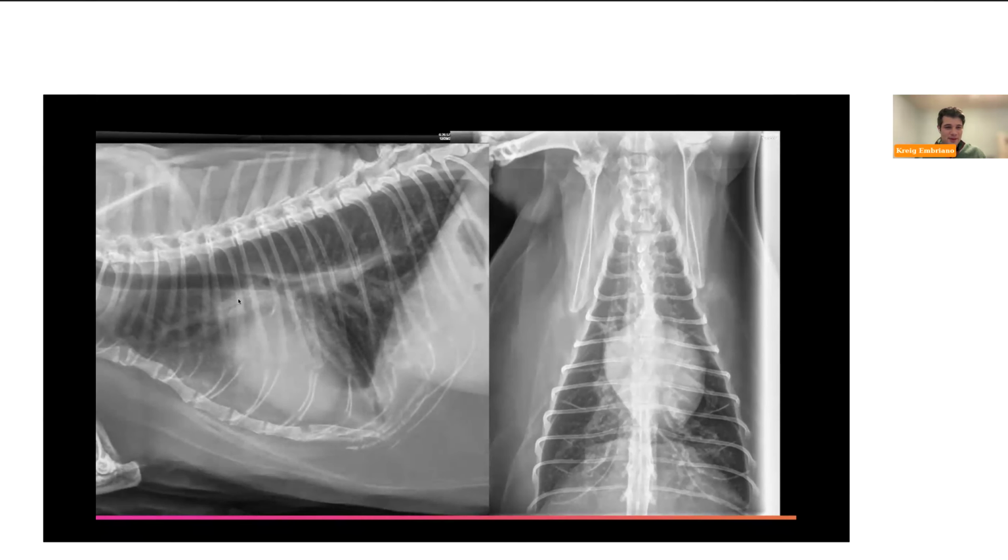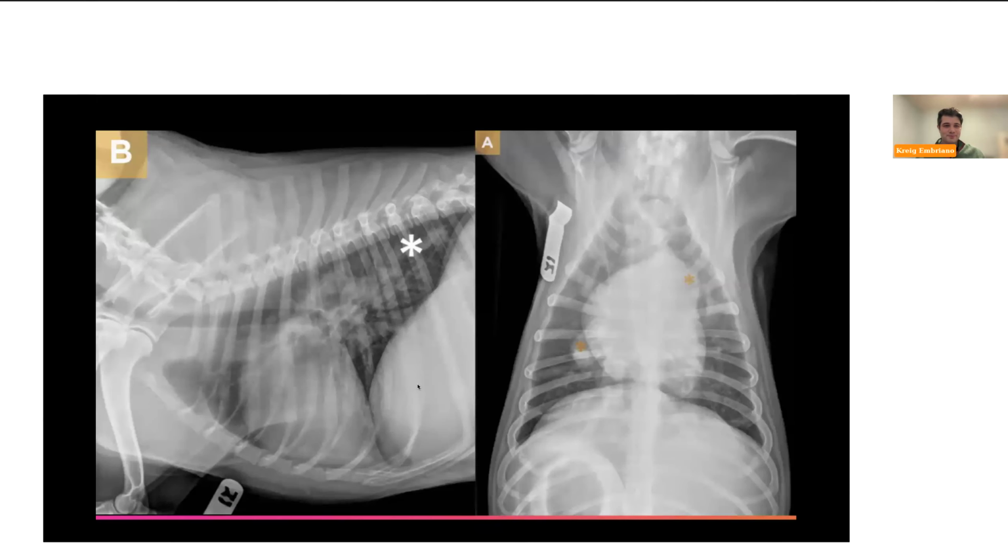The opposite lateral view is the same thing, very chunky vessels. You can see tertiary vessels. You have this infiltrate that's ventral and mid-caudal. That's the typical distribution for cats with left congestive heart failure. Also some pleural fissure lines, because cats with left heart failure get a little bit of pleural effusion as well. Very unique, unlike dogs.